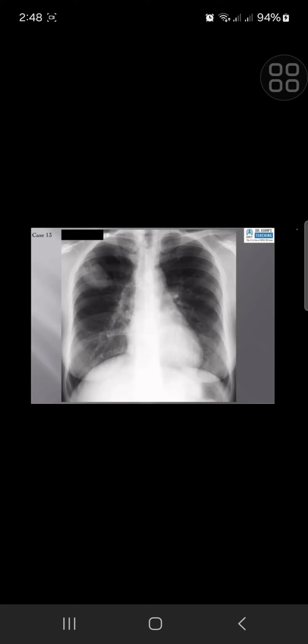I wonder whether this patient has a history of previous TB, and I would look at previous imaging to look for any cavities, because often these can grow in pre-existing cavities.